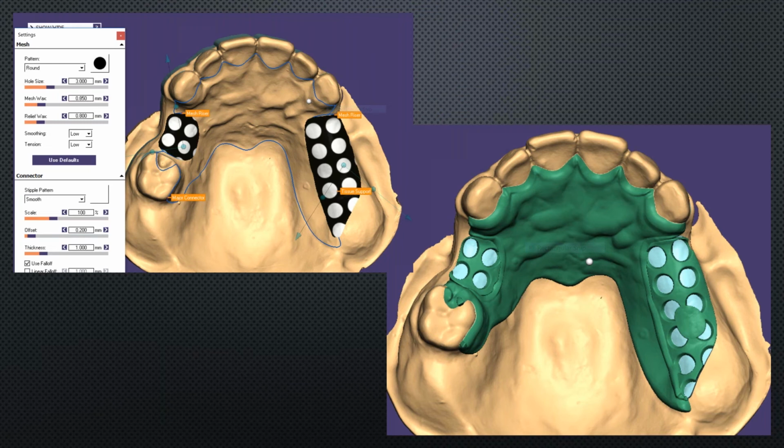We want that to be, again, 1 to 1.2. The broader it is, the thinner we can go. All right, so I would say if you have something of this length here, you could probably be at 1. If you want a little bit more rigidity, you could take it up to 1.2. I would never get any thicker than 1.4 with this material for any reason.